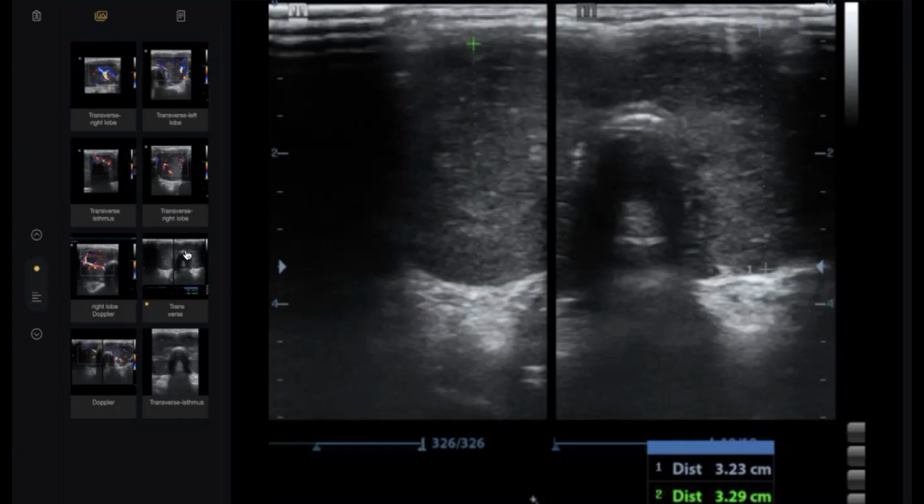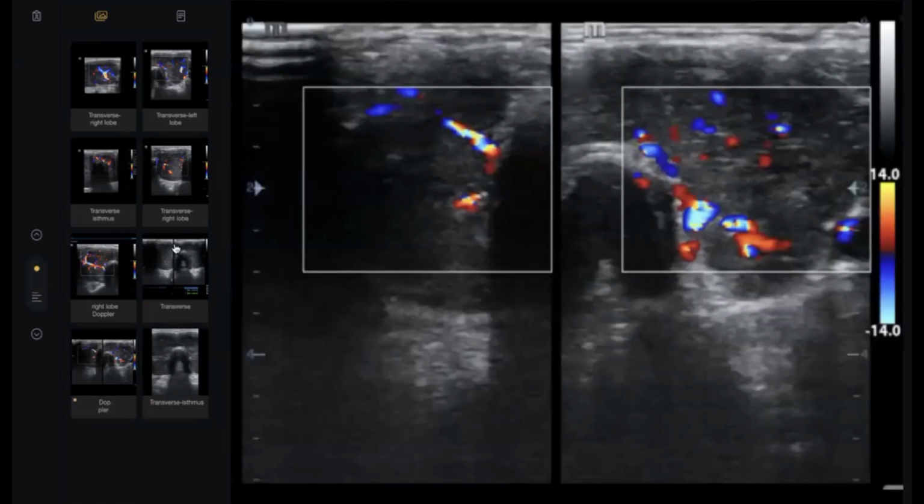Okay, doctor, what will you do next? What are you worried about in a Graves patient? Graves is a multi-system disorder. It can affect the orbits, it can affect the digits. So I would make a complete study. I would like to check the airways, as a diffusely enlarged thyroid may be compressing them. I would like to correlate with the patient's autoimmune profile. What about the hand?